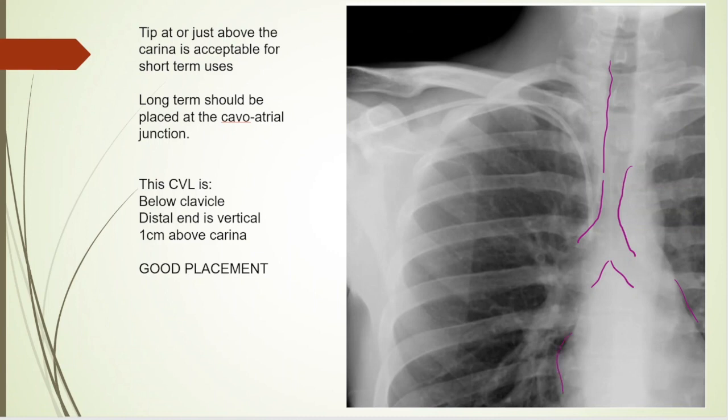Okay, so E for everything else, we look at the left side only since that's what is given here, and you see good vascular markings all the way out. Of course, this is scapula here. Don't confuse that with a pneumo. Here's your first rib, and this is second rib, third rib, fourth rib, fifth, sixth. And of course, we see the carina really well here.